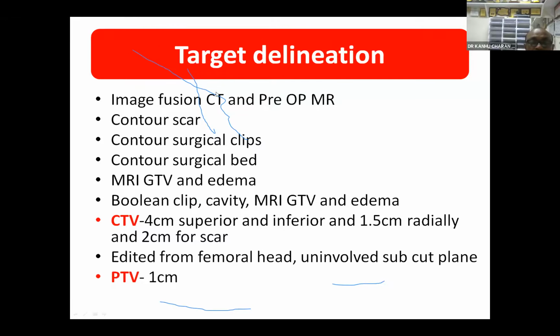So we did image fusion of pre-op MR and pre-op CT. We contoured the scar, the surgical clips, and the surgical bed. On the MRI, our GTV was MRI GTV plus edema.